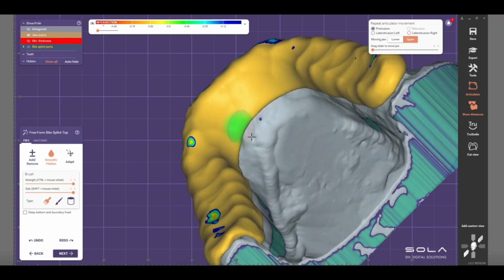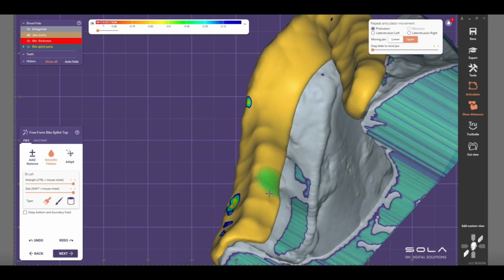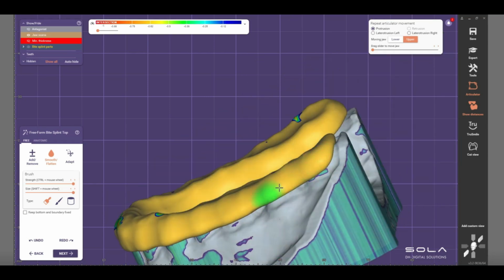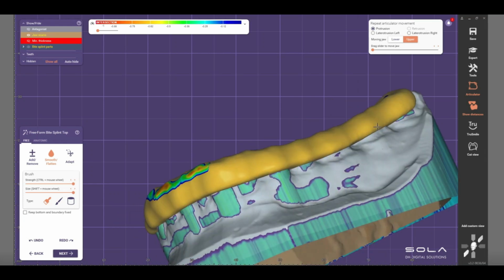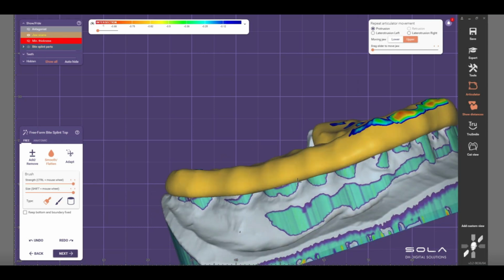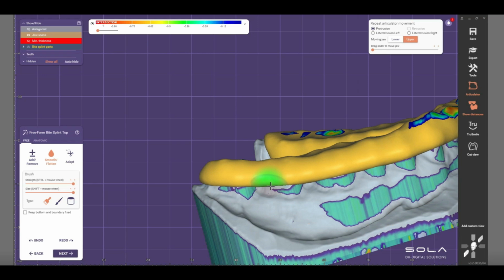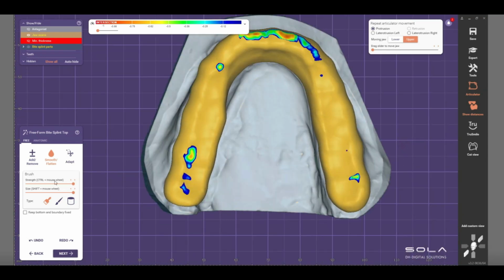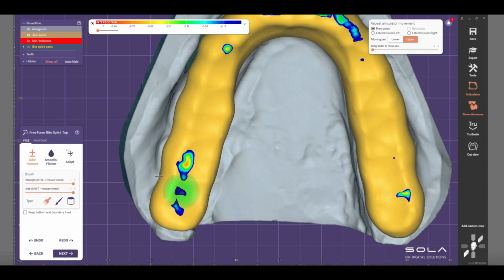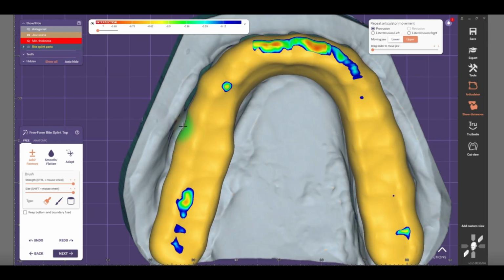It's straight and perfect. So I would do that. Make sure it's straight, round the edges, round there, all around the night guard. Okay, so once you've done that, then I would do add, and I would add those areas where it's not straight, right from the top area.